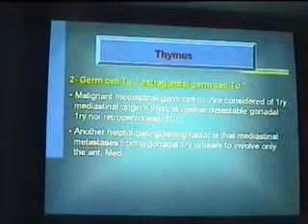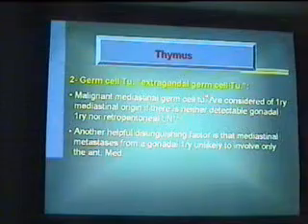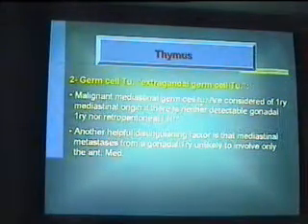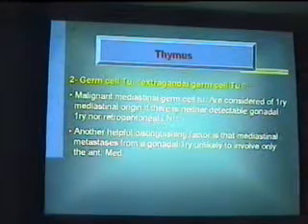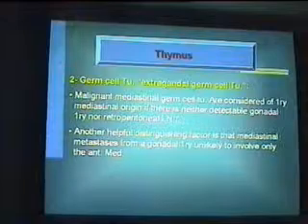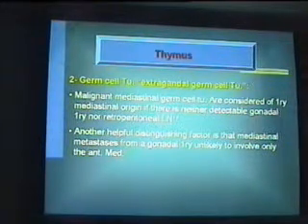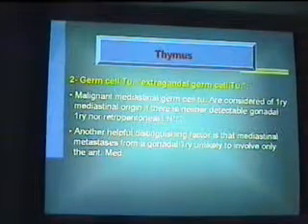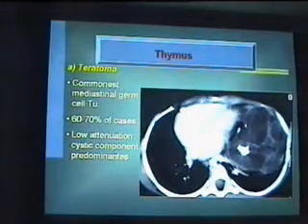Okay? يبقى هنا السلايد بتقول لنا ان malignant mediastinal germ cell tumor are considered of primary mediastinal origin if there is neither detectable gonadal primary nor retroperitoneal lymph nodes. ساعتها نقول ان this is a primary germ cell tumor. Another helpful distinguishing factor is that mediastinal metastasis from a gonadal primary is unlikely to involve only the anterior mediastinum. صح؟ تمام. ودي منظر التيراتوما.